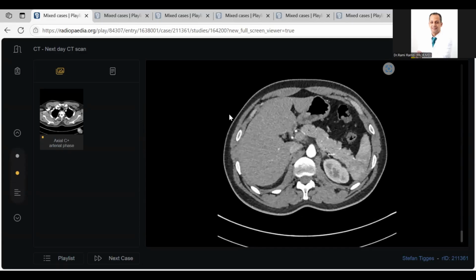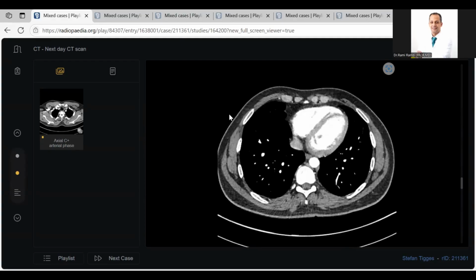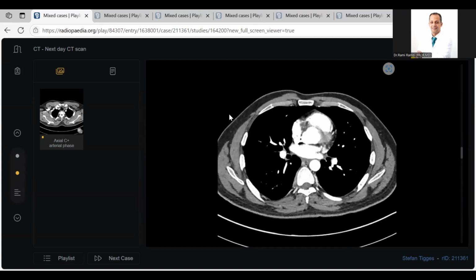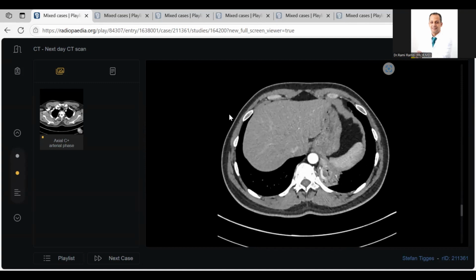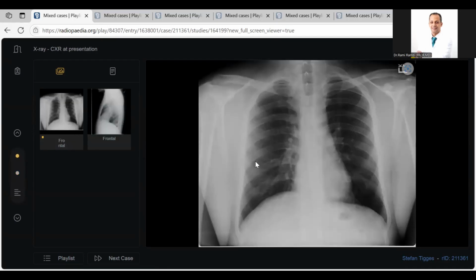Excellent. So what could be your special diagnosis? It's a pulmonary sequestration, most probably of an intralobar type, as it's an adult patient who presented in his 20s. Had this been extralobar, the symptoms would have been apparent much earlier.